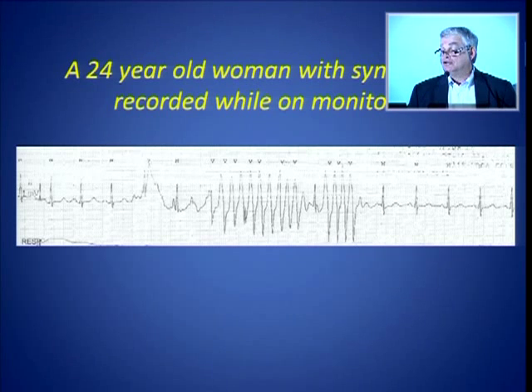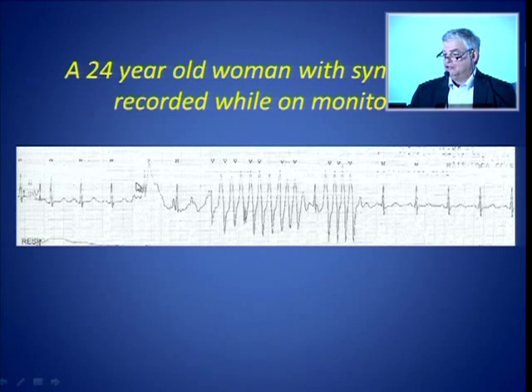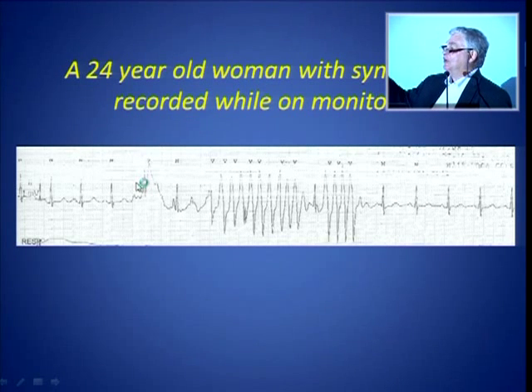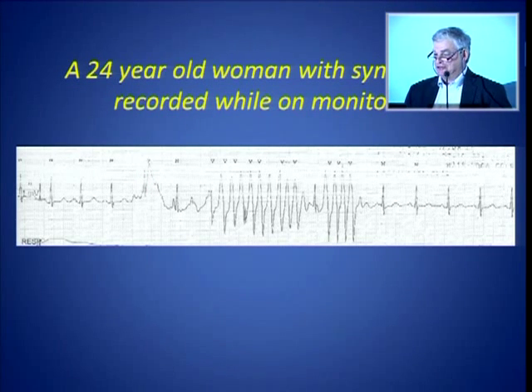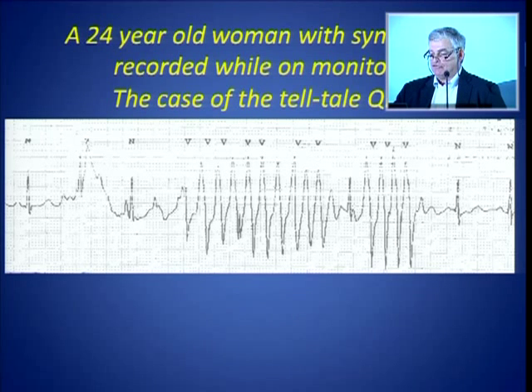You have to look. So what do we see? PQRST, PQRST, PQRST, and then we see junk. Something happens. Well, we see a QRS there, don't we? But clearly there's artifact. So when there's one artifact, when one lead's loose, think that everything's loose. And then what else do we see? Well, we see this right in the middle. And then we see this. What's this? So now you have to look closely. I'll blow it up again for you. And you take your intervals and you measure.